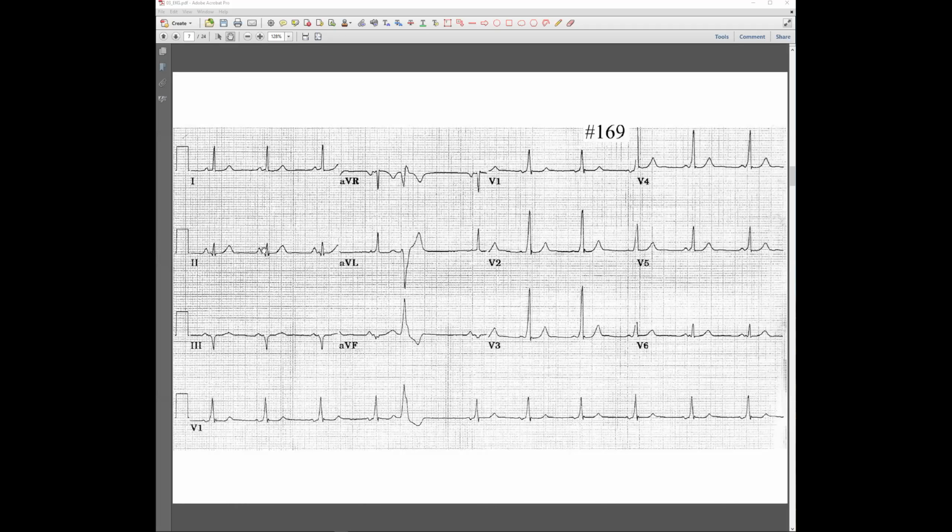Can you explain what's a P pulmonale? P pulmonale is a right atrial hypertrophy. That was your homework, that you should watch the video.